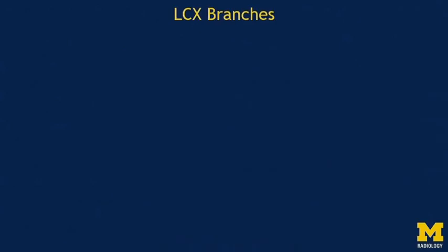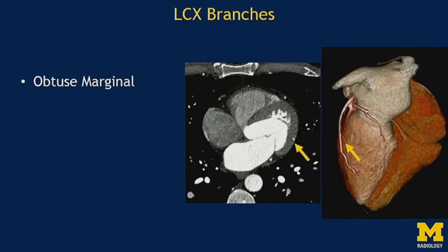The important branch of the circumflex is the obtuse marginal branches, which supply the lateral wall of the left ventricle. So here is our circumflex artery, and this is an obtuse marginal branch. As you can see, it's supplying the lateral wall of the left ventricle.